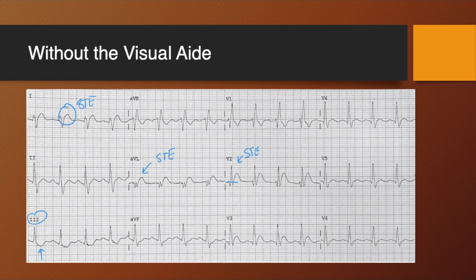And again, this is that classic, let me move this up here. There we go. So this is that classic South African flag. Let me get rid of that green. There we go. So if I draw the green arrow on the South African flag, you can see that those 4 leads are the ones that are impacted.